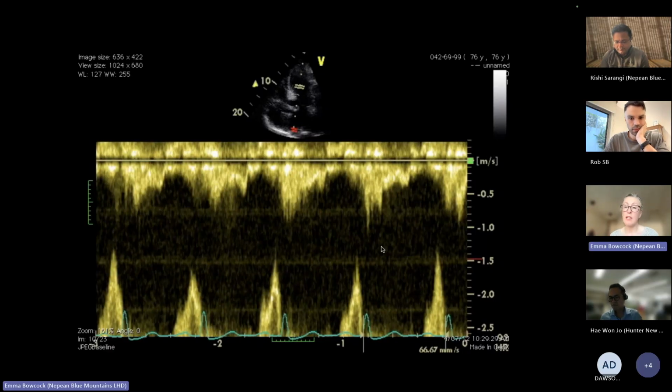So just make sure that you're able to look at some Dopplers of different aliasing phenomena, because it's common that it comes up. For example, a mitral inflow trace with a wraparound in systole, and there's going to be an MR aliased trace next to it. And be able to explain what you would do to get rid of it. Obviously, with continuous wave Doppler you don't have aliasing phenomena. Just be able to explain that in quick, simple language, but it's really all about the clinical relevance and what you would do at the bedside to change it.